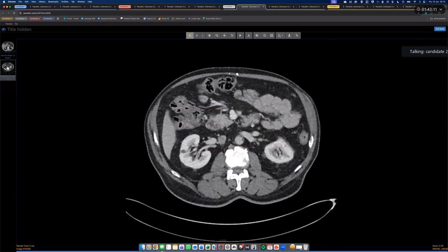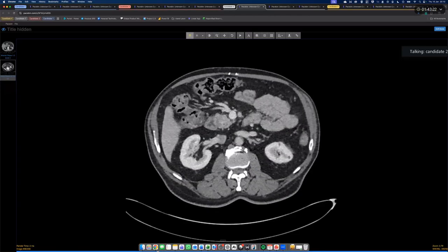Yes, so this area appears to be a bit lobulated, bulky for the rest of the pancreatic parenchyma. In my actual practice, I would window the region a bit to make it more apparent. It is causing pancreatic ductal dilatation.